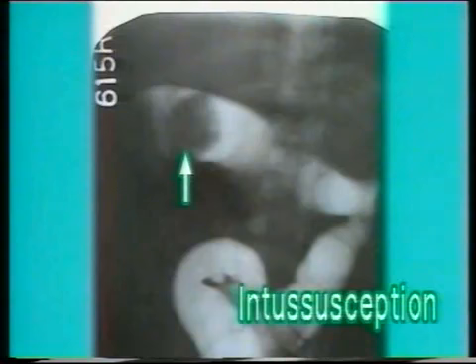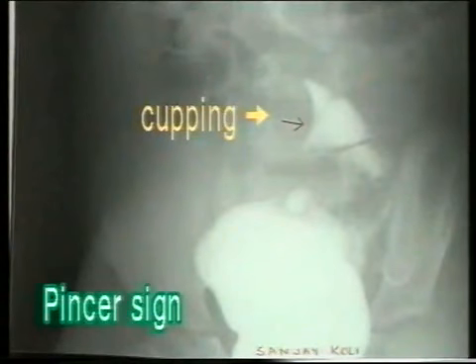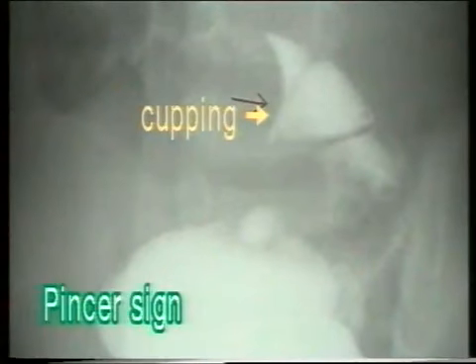This is another case of intussusception. The pincer sign is unmistakable. The intussusceptum is surrounded by a thin layer of barium and its head is in the transverse colon. This is another X-ray showing ileocecal intussusception. Note the shadow of the intussusceptum and the pincer sign or cupping of the barium head. This is another X-ray showing the head of the intussusceptum reaching almost the splenic flexure.